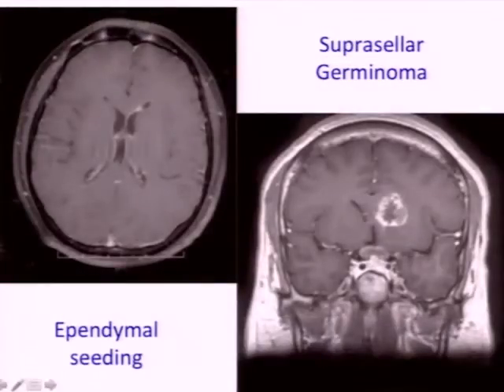Now, what I have here is the post-contrast imaging, relative to the T2 images that I had just shown you. And on the outside study, this was actually missed.